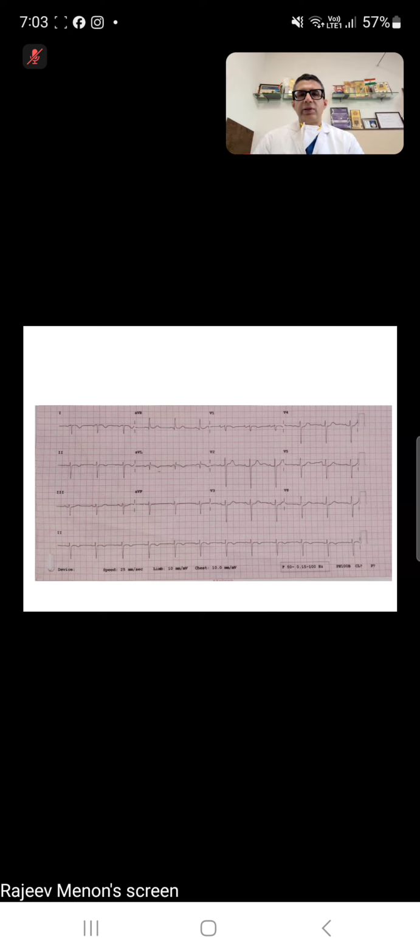So now the question is, why can't this be a dextrocardia? So the heart is now on the right side. So that's the reason why you are having this type of ECG where L1 is negative and AVR is positive. Amir? Sir, the R wave progression is in the reverse direction in the chest leads. And in the limb leads, there will be negative QRS complex, including P waves and T waves, sir.